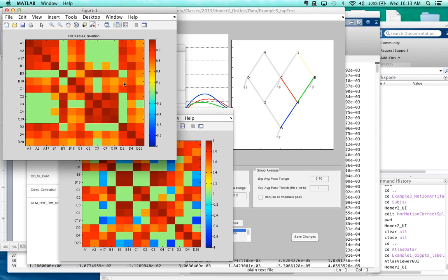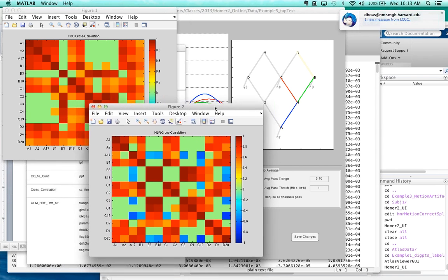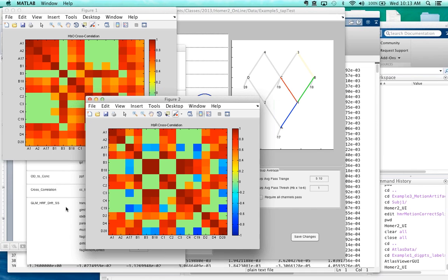Of course, if you're looking at resting state functional connectivity, you have to do some pre-processing first because you want to remove the common mode to all the channels. So maybe that's what Vincent's question was getting at. This functionality is there if you want to explore it, but it's still in its infant stages. It's not used in many other functions at the moment.